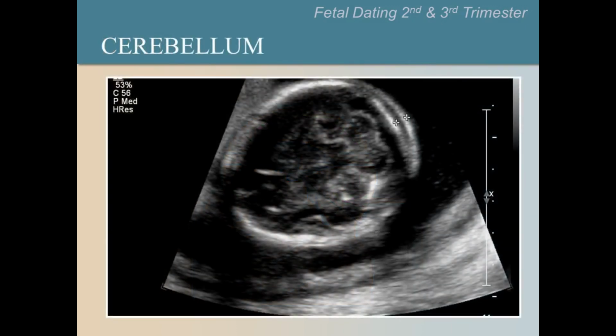This is another view of the cerebellum. Look for the shape of a very fat 8. We have outlined the cerebellum here to make it more obvious.